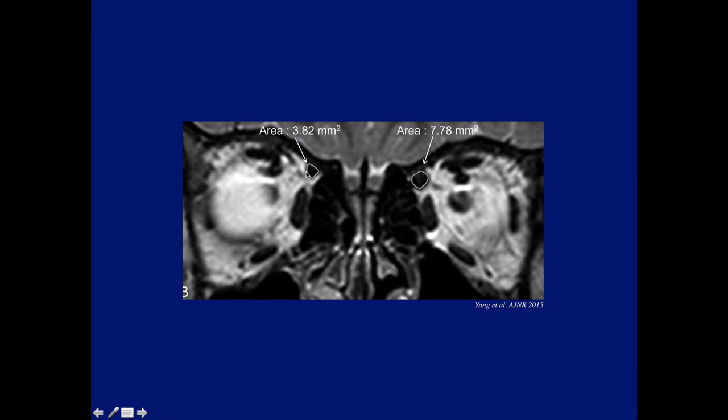And they found that a large number of these patients have much smaller hypoplastic superior oblique muscles. And they find a high correlation with the size of the muscle with the abnormalities, atrophy or absence of the trochlear nerve. So this is what they're using instead to diagnose these, mainly children, with abnormalities of the trochlear nerve.